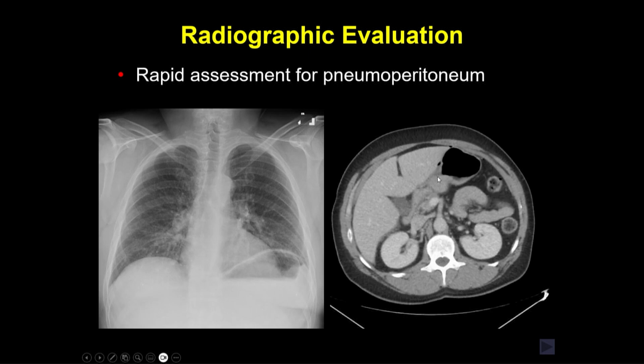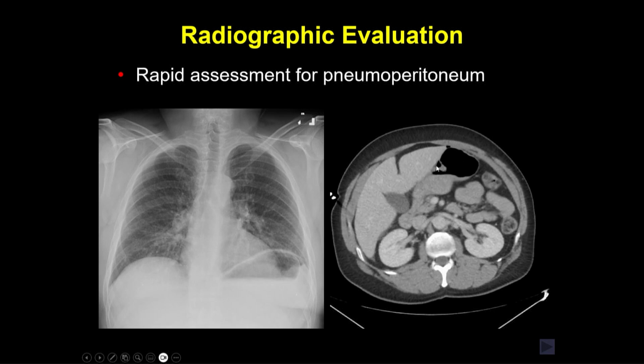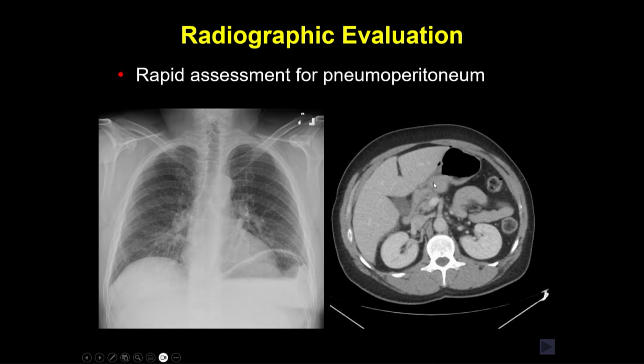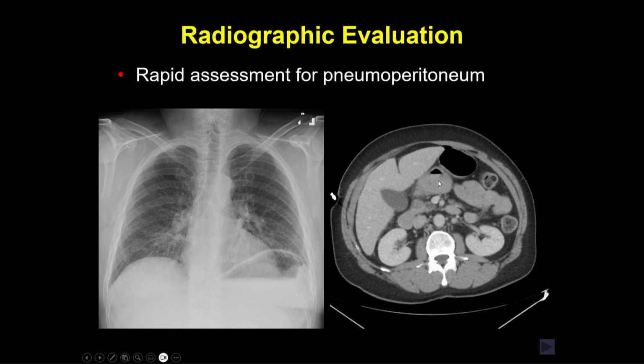And when I see that, I'm thinking gastroduodenal ulcer first, because you typically won't get gas entering the lesser sac and then seeing it elsewhere. So it'll always start there typically. So that's why I look very hard. The ulcer isn't super obvious here, but it's there.